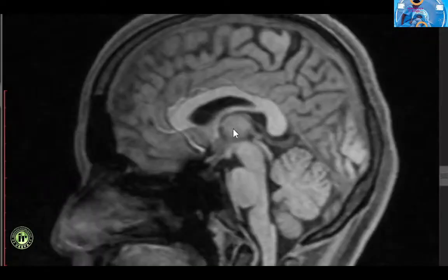The diencephalon is situated between the cerebral hemispheres and brainstem and borders the third ventricle. It consists of the thalamus, the pineal gland, habenular commissure, and the hypothalamus. The habenular commissure and pineal gland are together known as the epithalamus.